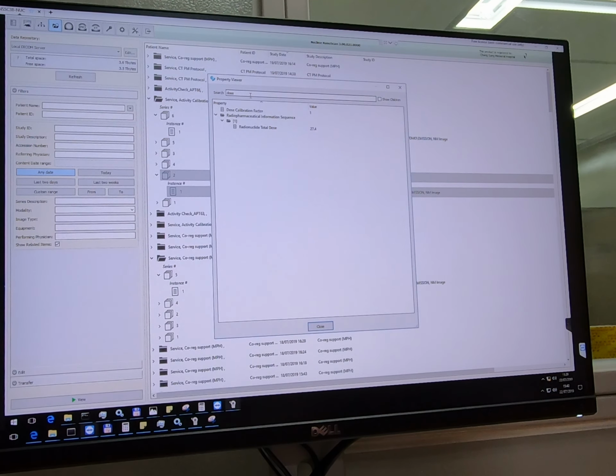Okay, and of course we can use the side view for positioning the blue box, so the field of view for the SPECT scan, but it seems to be a little bit not clear enough. So there is a palette window on the right side, and if you press the right click, you can reset it. I don't know, somehow this windowing is not correct.